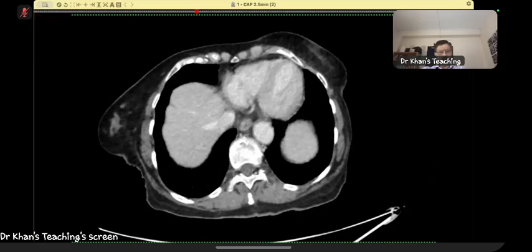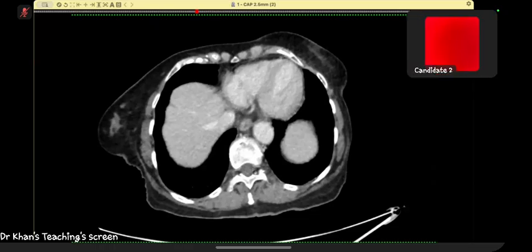Okay, conclusion. So in conclusion, this is likely representing malignant neoplasm of the esophagus causing pseudoachalasia. So this would require urgent referral under a two-week wait pathway to the upper GI MDT for further discussion and management, and a possible endoscopic biopsy can also be done.